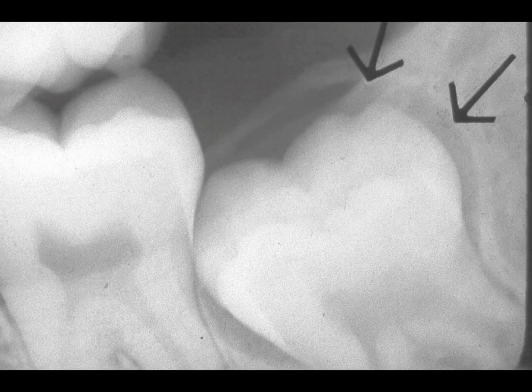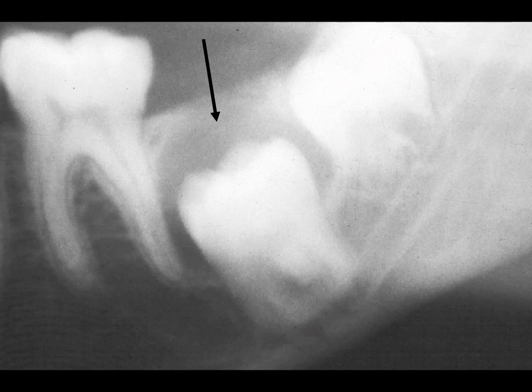Another anatomical structure closely related to the tooth is the radiolucency that we always see around the crown of a developing tooth. This is called the follicle. Normally, this is quite a narrow radiolucency and is a normal feature and should not be misinterpreted as disease. However, in some cases, the follicle can undergo cystic change and may become visibly wider on a radiograph.